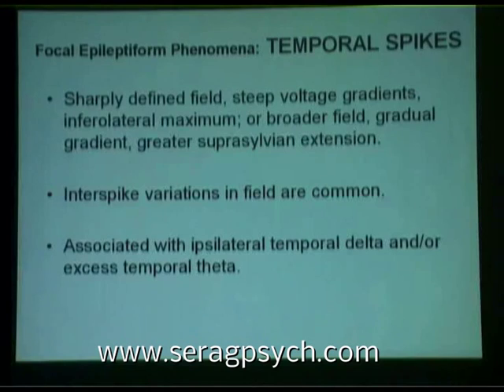And you remember earlier today when I showed some of those temporal lobe seizures, I was showing you that during a temporal lobe seizure you actually have at least two or three different seizures going on at the same time. It looks like one, but if you look very carefully, you'll see different rhythms. Same thing with the spikes. In between seizures, there might be variety in the field. So a lot of times in the temporal spikes, there's going to be more than just spikes. There are going to be other abnormalities, and I'll show you an excellent example of that later. Next, please.